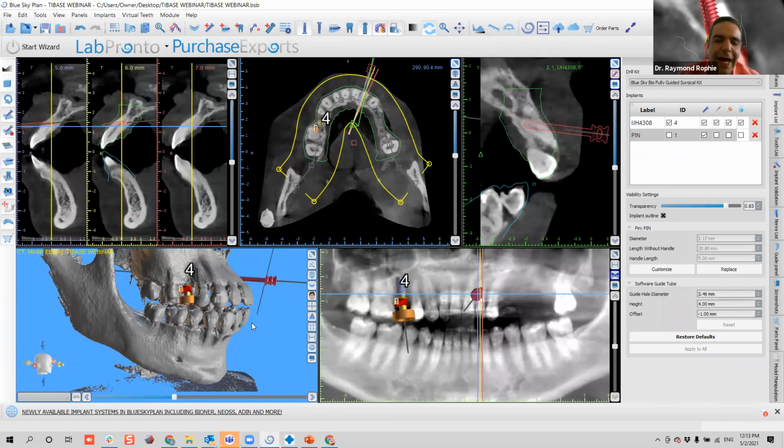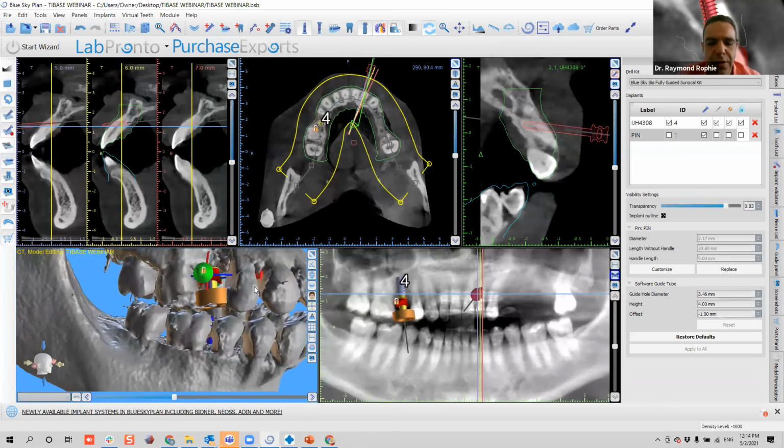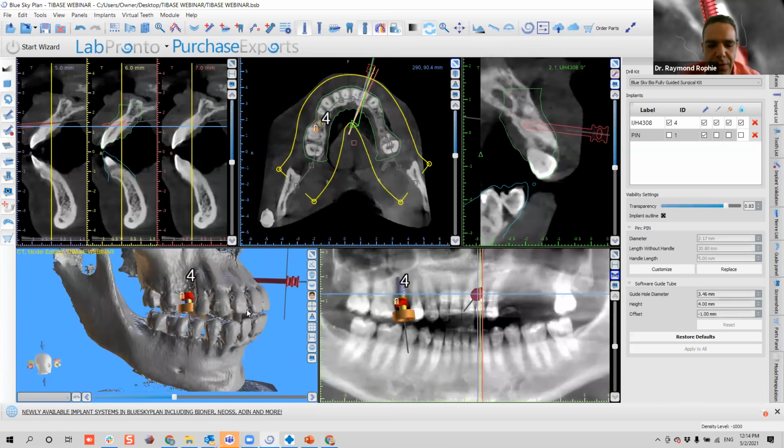You know what, Brian? Even though you could, by using just the anatomy tooth that you're bringing in, yes, you can do that. Actually, I'm finishing a teeth library, I hope it will be in the libraries soon, that will have the emergence profile, basically all the teeth with the tie bases. It's what we were talking about in the beginning, an ideal fluted shape emergence profile.